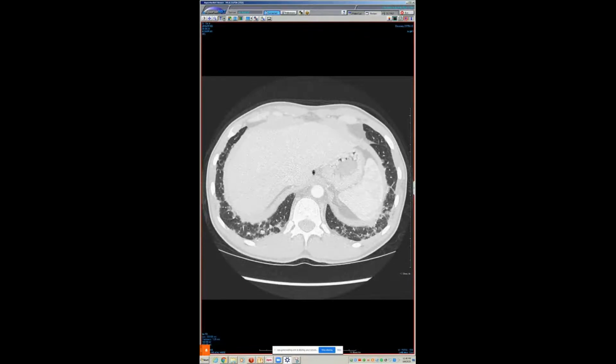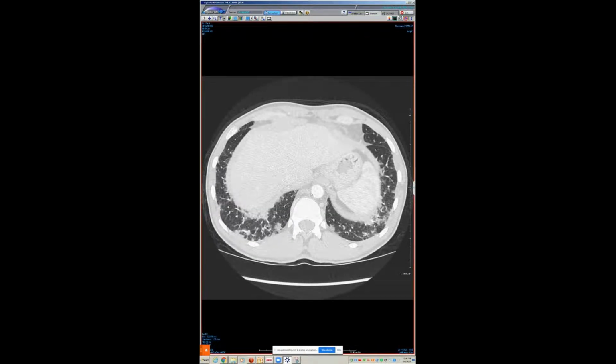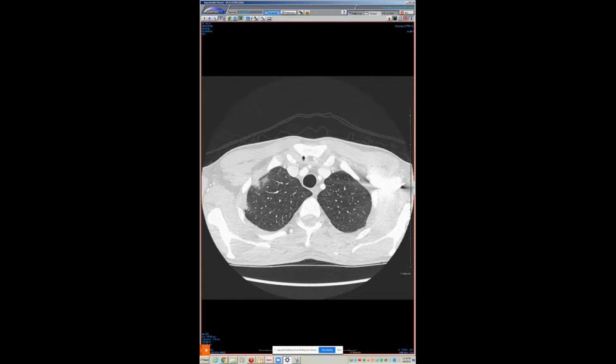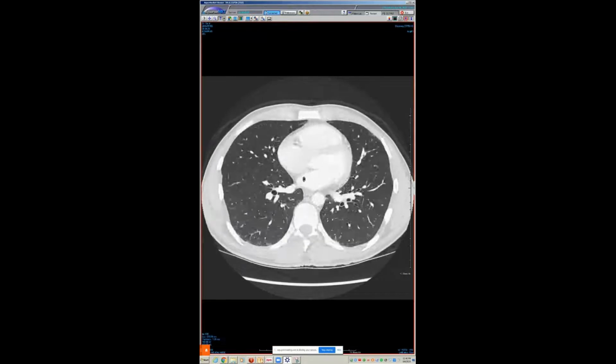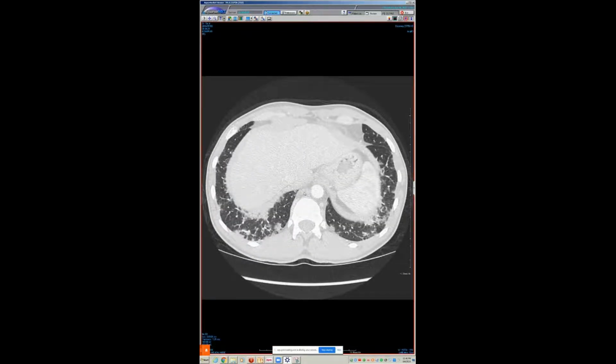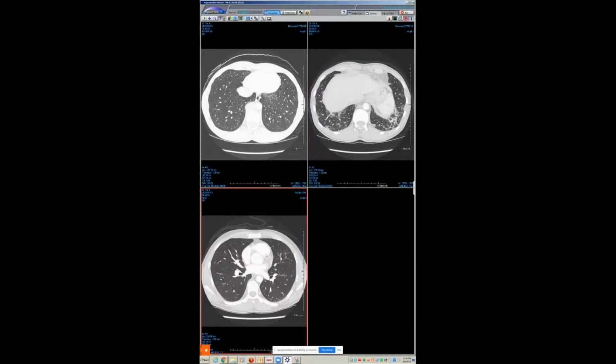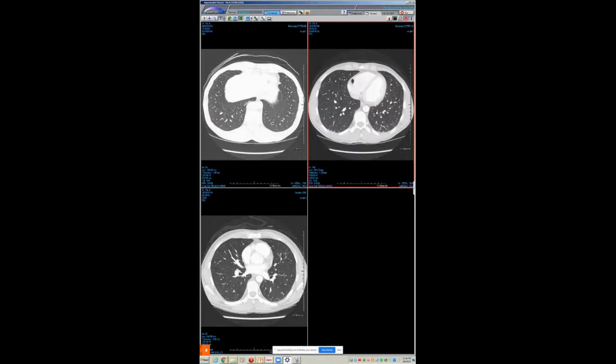And here was kind of a more, I don't know what people would call this, organizing pneumonia, some sort of abnormal peripheral subpleural areas of consolidation, ground glass, some reticulation. Anyways, so looked up his history. He had a history of testicular cancer and was put on bleomycin just a few weeks before this CT.